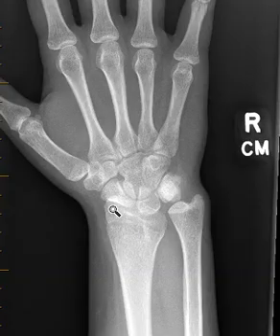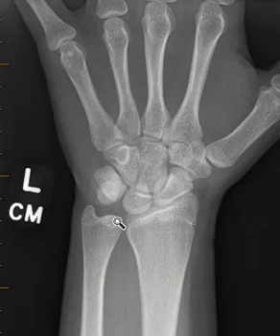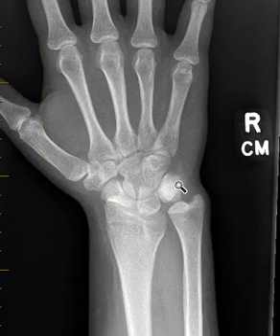These are some X-rays. The X-rays show the same slanting downward. We see that the radius is shorter than the ulna, so an abnormal appearance. If we look at the other wrist, this is the right wrist, she has findings that are not quite as severe. She does have this slanting of the distal radius, but the ulna is about a normal position relative to the adjacent radius, and there's room between the distal ulna and the carpal bones. But on the left side, things are more severe, and there is narrowing between the ulna and the carpal bones, and we'll see this a little bit better on the MRI.